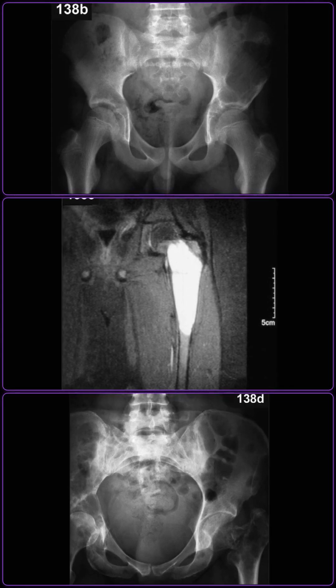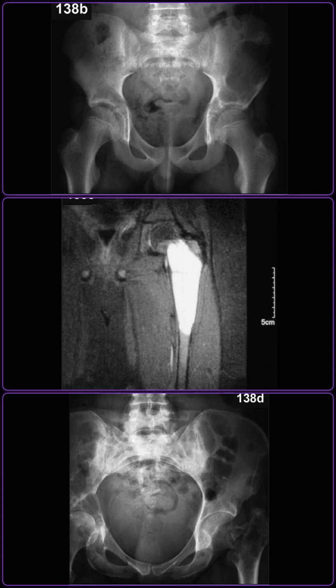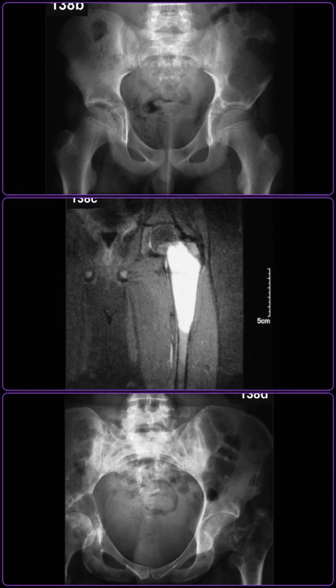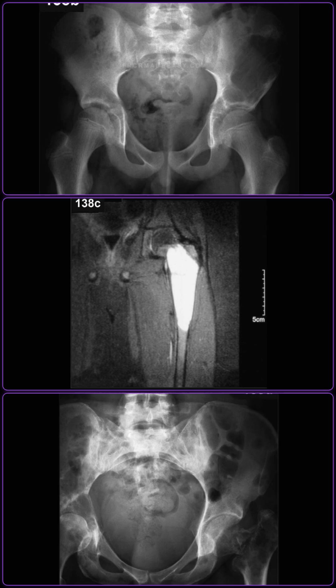The elderly pelvic radiograph shows aggressive, widespread lytic metastases from breast cancer with cortical destruction and a wide zone of transition. There is a pathological fracture of the left femoral neck in this metastatic case, illustrating the features of an aggressive lesion compared to the benign simple bone cyst.